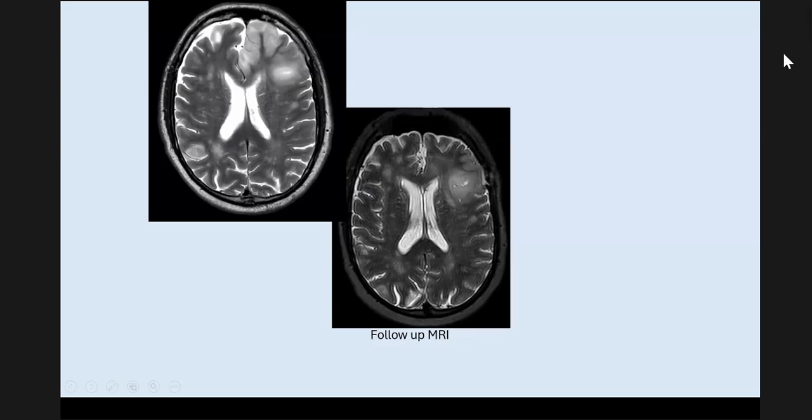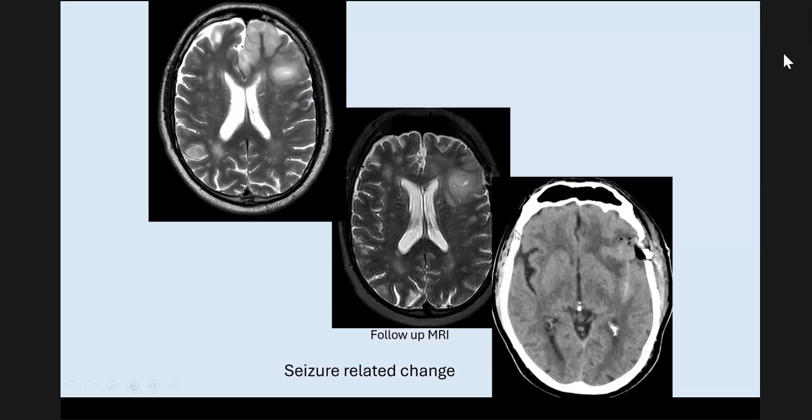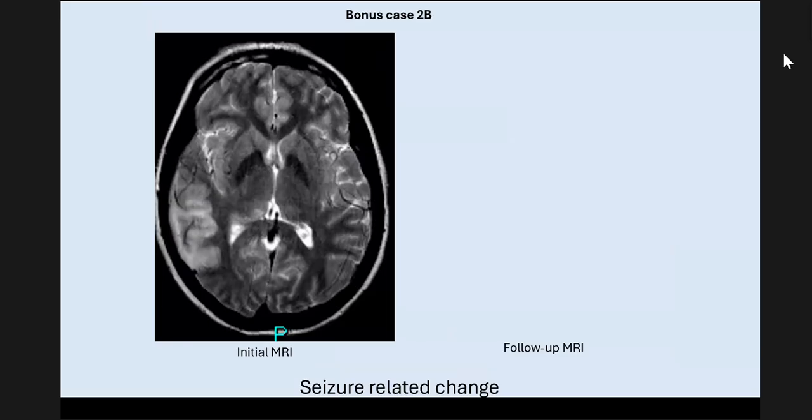So when the surgeons went in, they just limited their surgery to the lateral aspect where the tumor was, and the anterior aspect was not touched. So the anterior aspect and the medial aspect of the frontal lobe, the mesial frontal lobe, was left untouched. And the changes which we saw earlier are all related to seizures. Okay, so seizure-related changes can occur anywhere. There are, of course, some specific areas which have the propensity to develop the seizure-related changes.